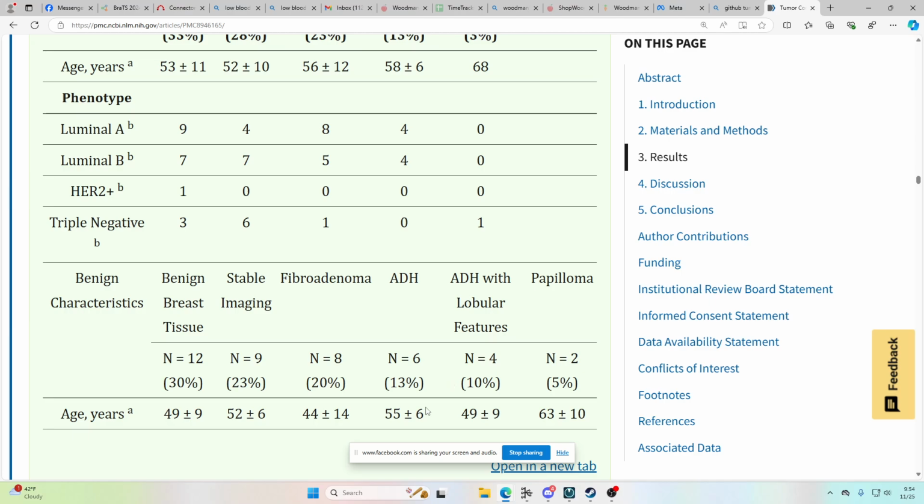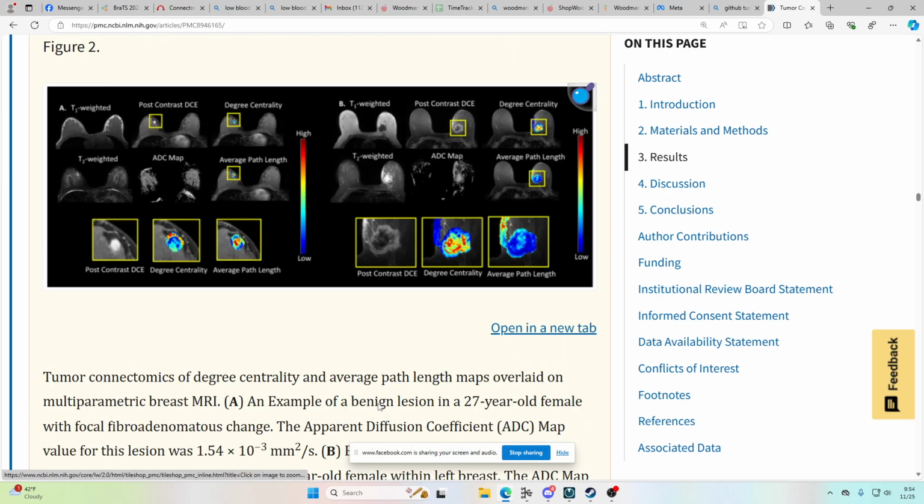The theory is that if two voxels have similar readings for T1, T2, and FLAIR MRI types, then they should have the same distribution of cancer cells.